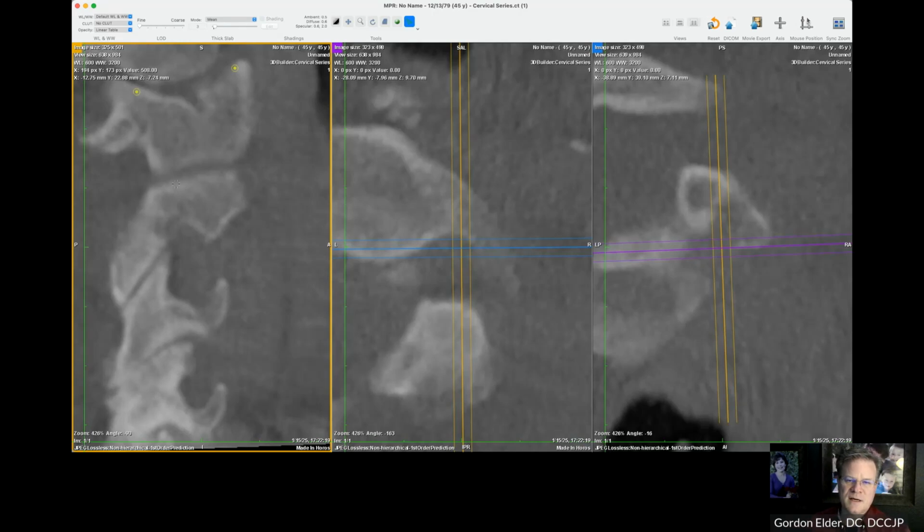So that's probably not significant in his case, but I'll write it down because in the Blair technique, I can choose which side, regardless of laterality, I'm going to adjust from and just adapt my contact point. Maybe I'll want to make sure I don't push this one a little bit further forward, and I'll choose a different contact point.